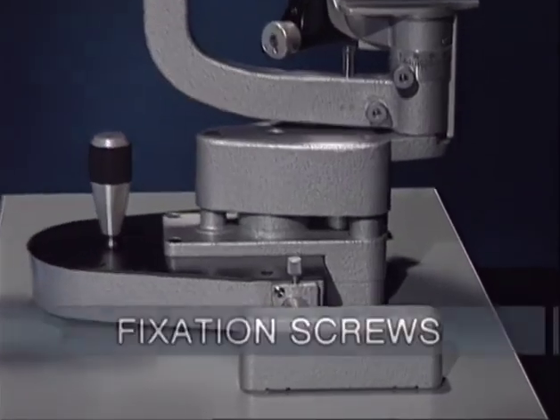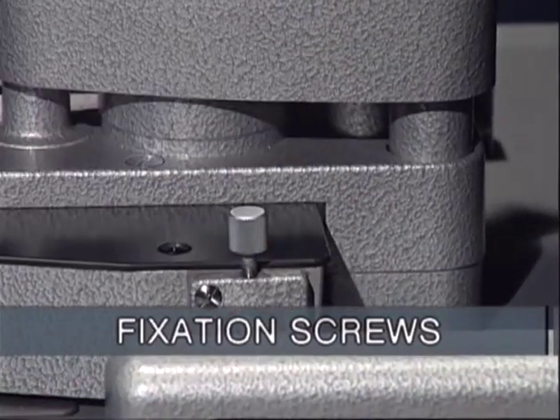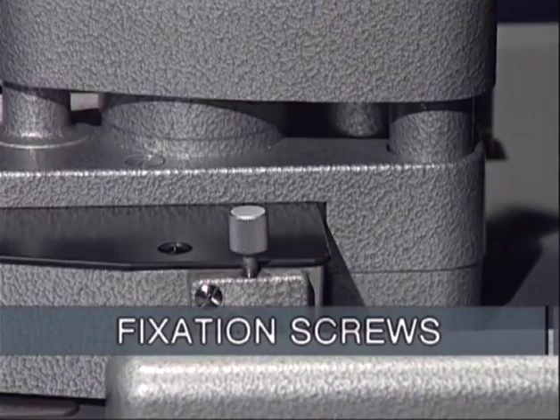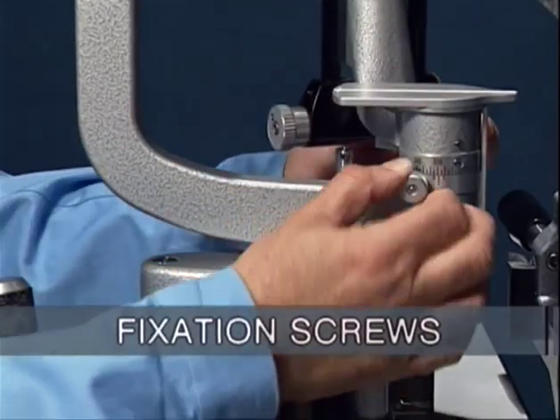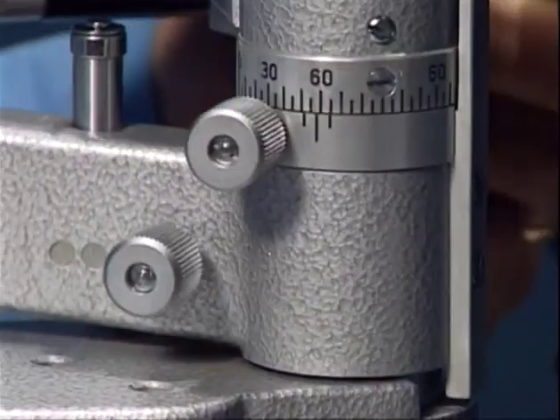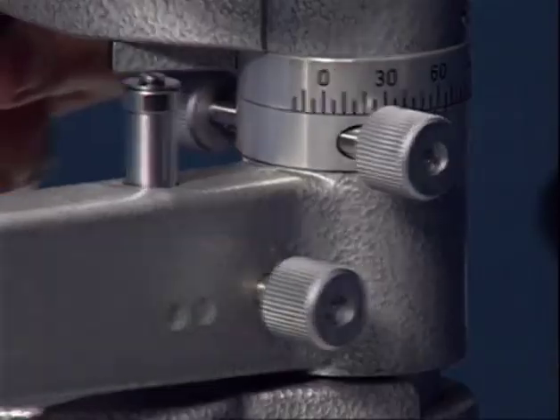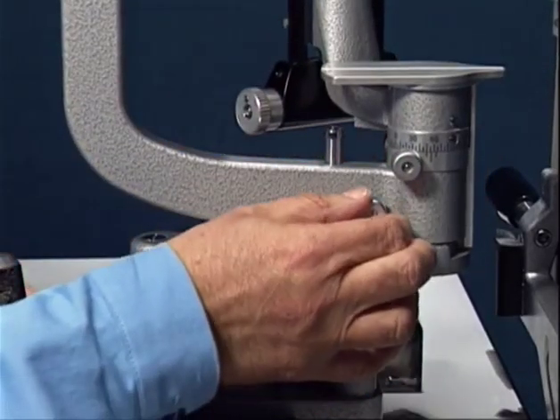To fix some of the angles and positions in a given setting, fixation screws exist. Here's the screw for fixing the horizontal movements of the joystick. Here's the screw for blocking the movements of the illumination unit, thus fixing the illumination angle. It can be read at this scale. The movements of the microscope can be blocked by this screw.